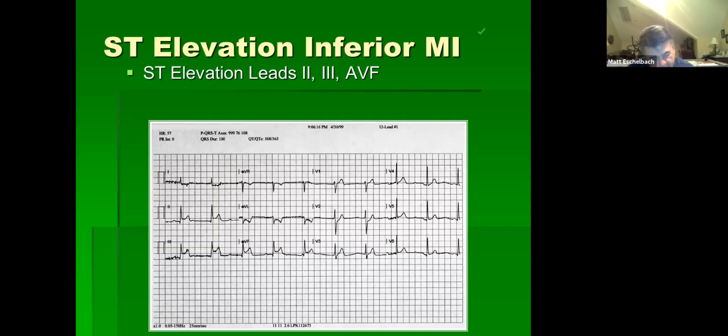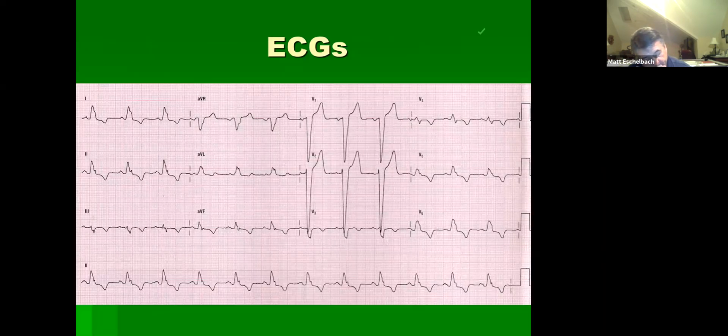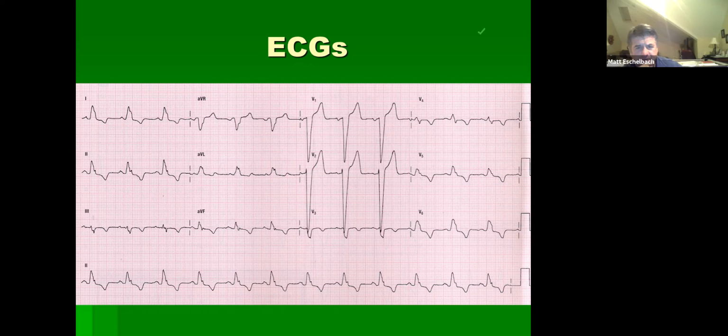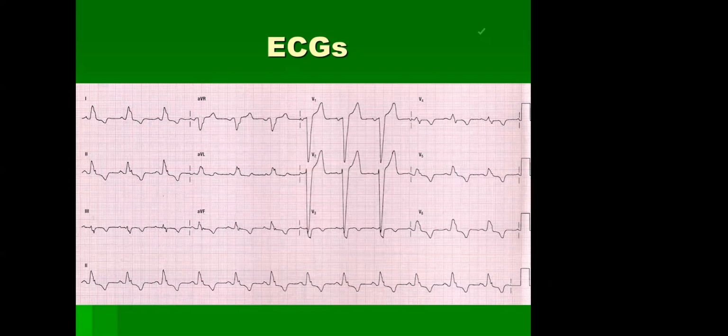All right. Here's our next one. Who's up next? I'm up next. So in lead 1, there's definitely an inverted T wave, as well as that little strange looking segment. Tell me what that means. A little spoony, right? Okay.